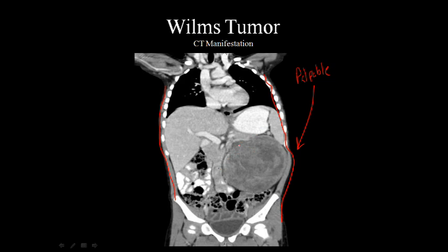And here you see that this involves the left renal collecting system, or the left kidney. Notice you have these areas of darkness like this, and then you have areas of contrasting lightness, and that is due to the contrast enhancement, which is caused by the malignant mass. So it's fairly obvious that this is a Wilms tumor.